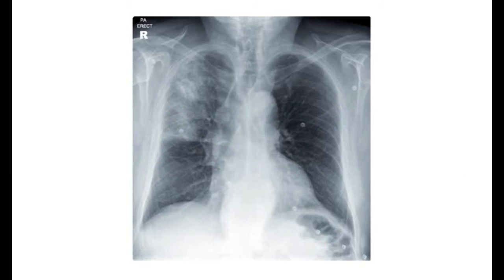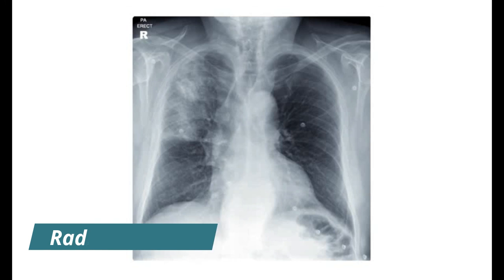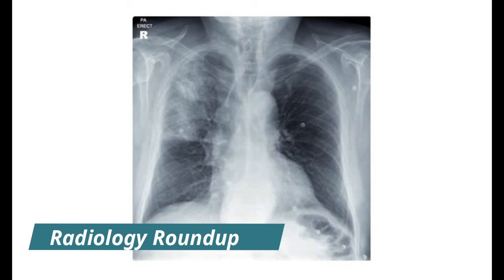So this is a case of right upper lobe consolidation. Here, this X-ray demonstrates heterogeneous right upper zone consolidation in keeping with pneumonia. The consolidation has a relatively abrupt inferior margin in keeping with the horizontal fissure, indicating this is right upper lobe pneumonia. A focal opacity in this region may represent focal consolidation or a mass. Incidentally, there is also a hiatus hernia.